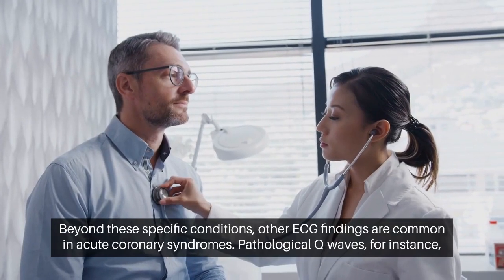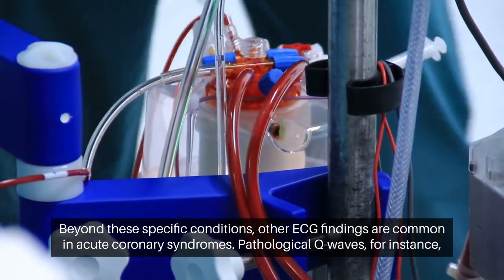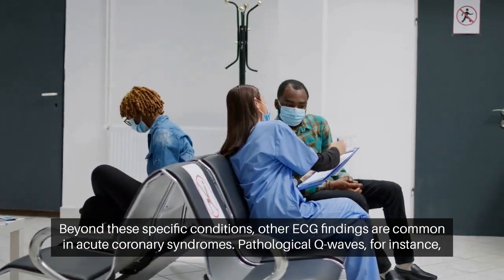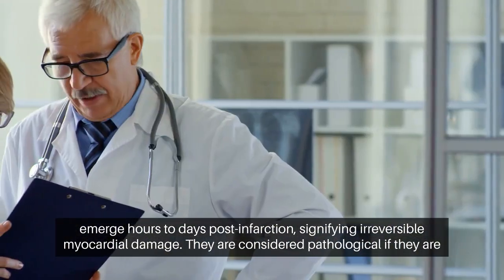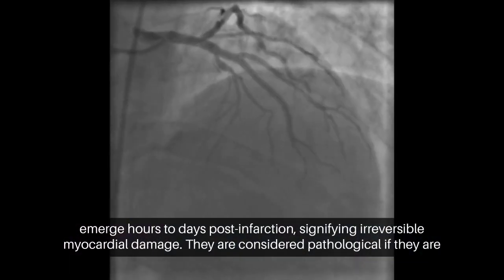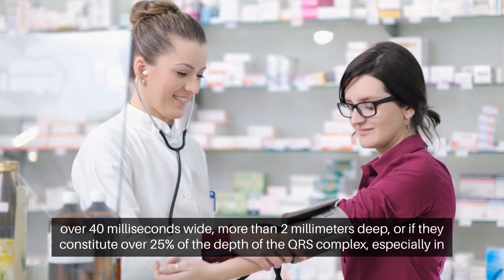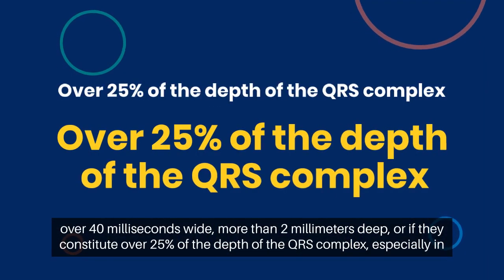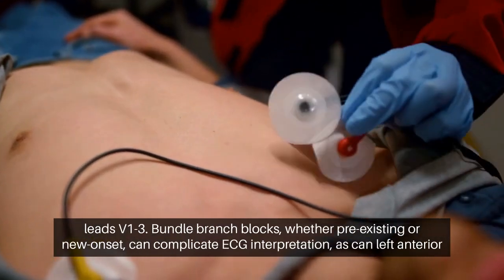Beyond these specific conditions, other ECG findings are common in acute coronary syndromes. Pathological Q waves, for instance, emerge hours to days post-infarction, signifying irreversible myocardial damage. They are considered pathological if they are over 40 milliseconds wide, more than 2 millimeters deep, or if they constitute over 25% of the depth of the QRS complex, especially in leads V1-3.